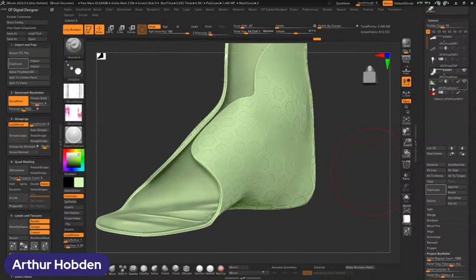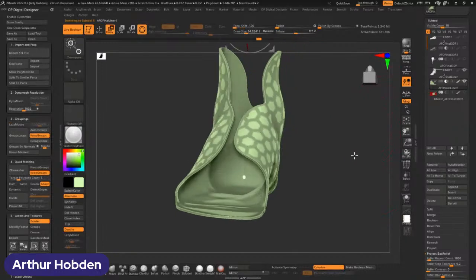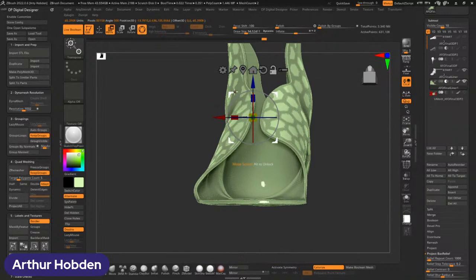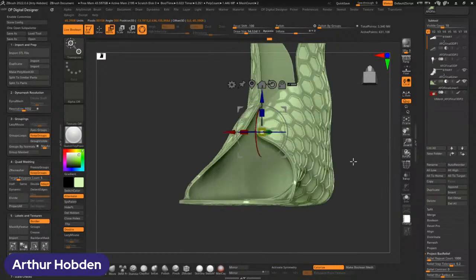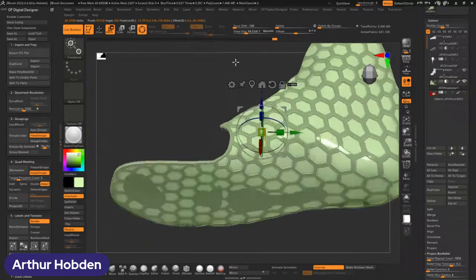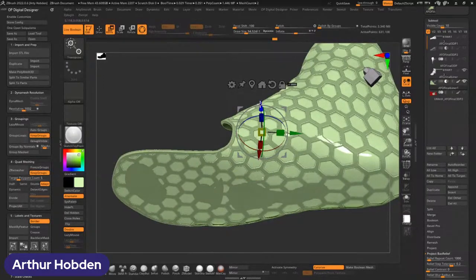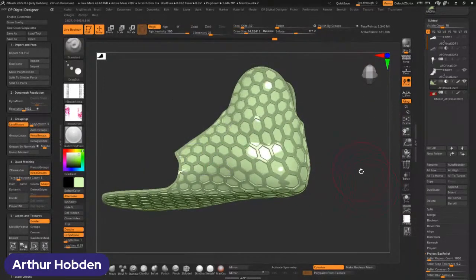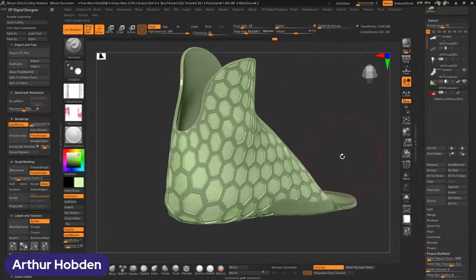It's not quite intersecting yet. So let's take this part here and go to the center of the part. And let's try bringing that in just a little bit this way and just a little bit this way. And maybe just a little bit up, just a little bit. There it is. There you have it. So it was pretty easy to do.